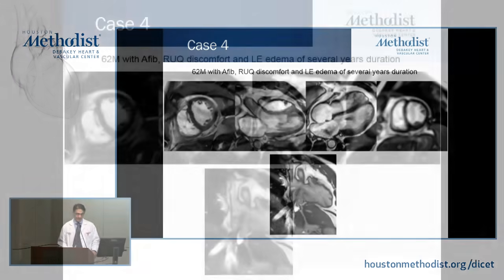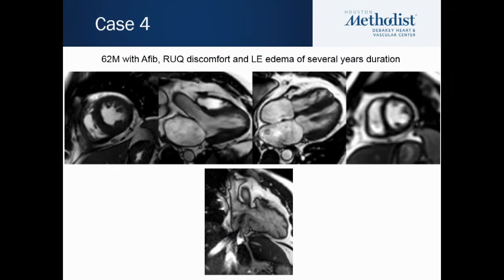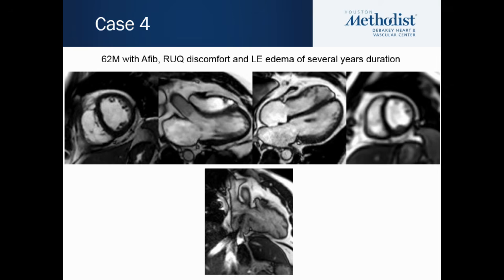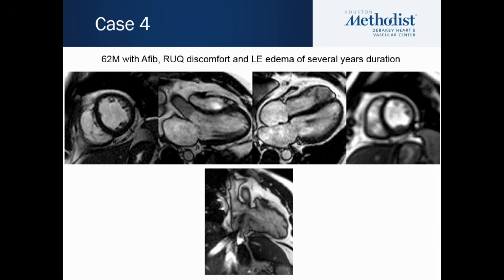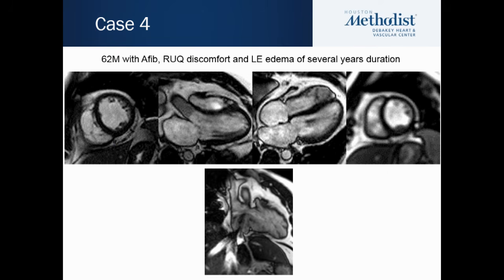Contrast that with this heart. Here, I hope you'll appreciate right away from just looking at these images, you have a ventricle that's conical. It's tube-shaped. It's being compressed. What is it being compressed by? Something here, anterior to the RV, right? If you look at these real-time images, I hope you'll appreciate there's the diastolic shudder.